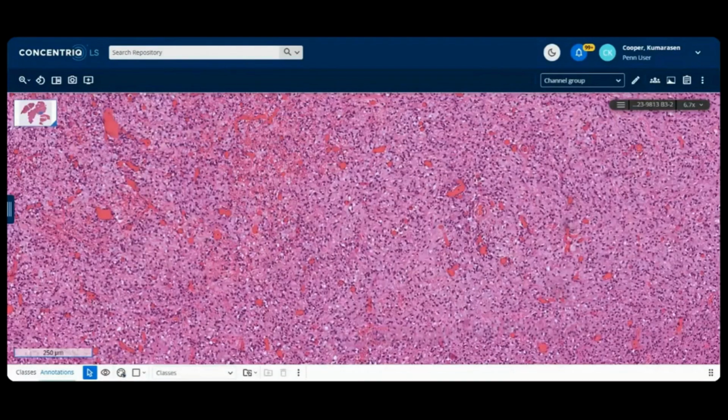EHE, epithelioid hemangioendothelioma, vascular markers. Remember, those are much more epithelioid with a lot more cytoplasm. And the stroma, yes, is a myxohyaline stroma. So that would be understandably why you're considering that. Mohan, the solitary fibrous tumor, yes, they can be myxoid as well. But S100 is a little odd for that. So CD34 going on to STAT6 will help in that regard.